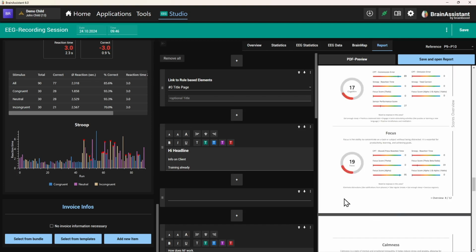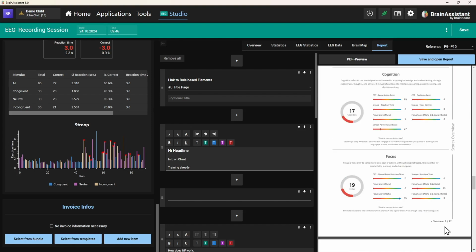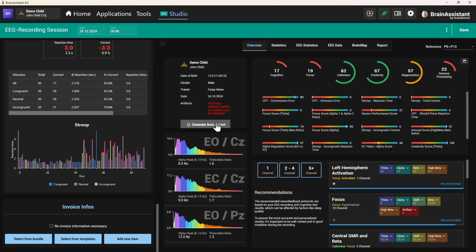How do we add maybe a footer or a header to our report? Here we think differently. We don't think in single sessions and reports for these sessions. We think in, well, you probably might want to add a page number on every report you ever create, and also, this is important, to the automatically generated reports. So this will be an overall function that we enable or disable.